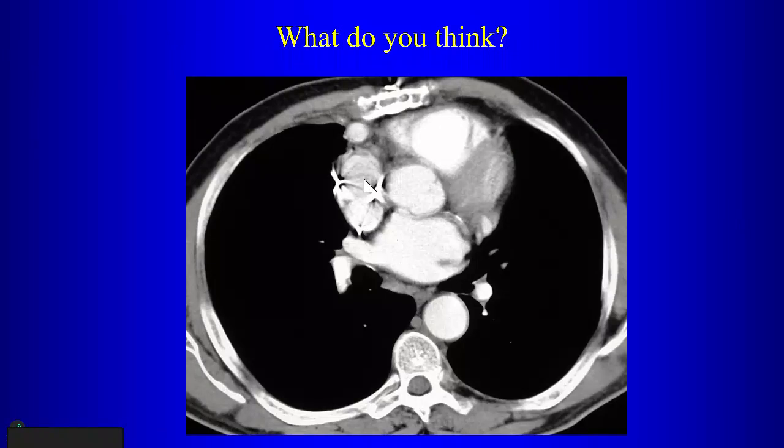This guy, right atrium, this guy, ventricle, this guy, and ventricle, this guy, aorta. Right. So there's this vascular structure here that you need to explain, right? And how do you know the patient's had a bypass graft? Sternotomy wires. They're sternotomy wires, right? So this patient has had a sternotomy.